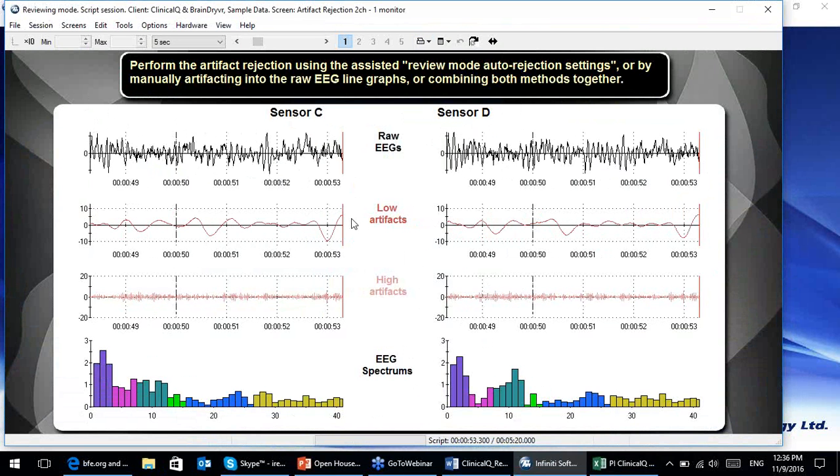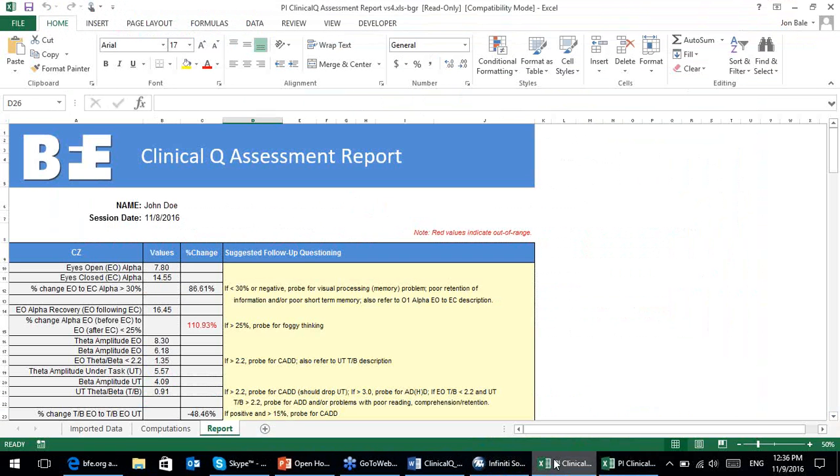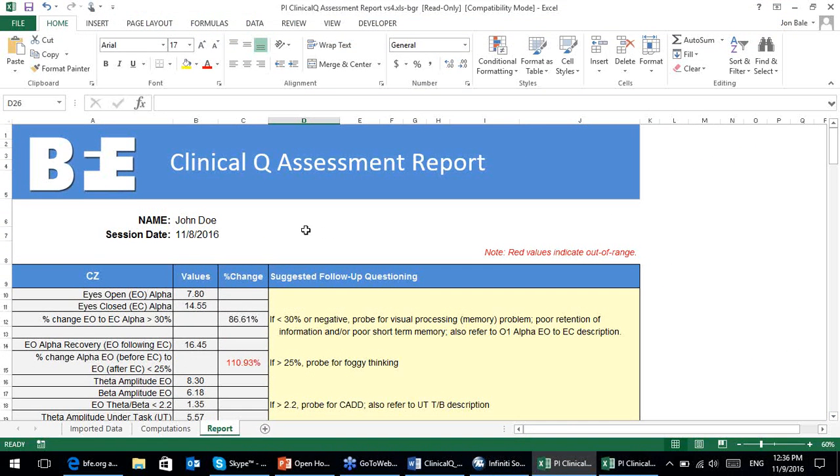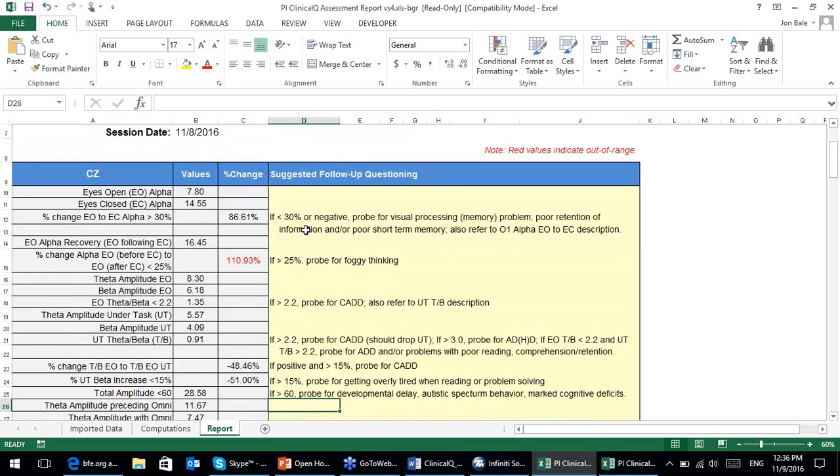And so click that. The computer's going to think for a moment. It's going to open up this new report. And here's the new report. It looks a little bit different. It looks a little bit cleaner. It's actually, I think, much better. It looks more professional in terms of what people are used to looking at in terms of these types of reports. The majority of these statistics have remained exactly the same.